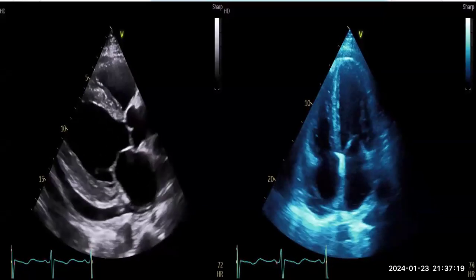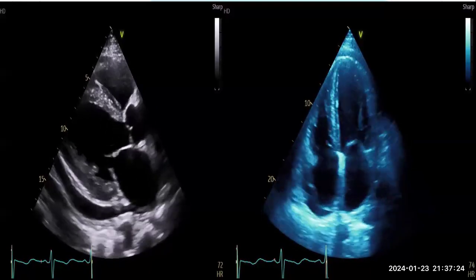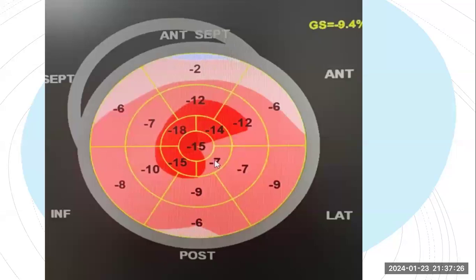One more thing that we did for this patient, a strain confirming the shape. This is the cherry on top strain pattern. You can appreciate that there is significant reduction in the longitudinal strain in these patients that spares or partially spares the apex. So this is the cherry on top, very characteristic for amyloidosis. Excellent, Mshari.